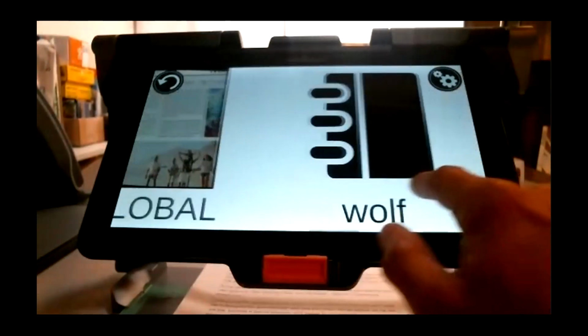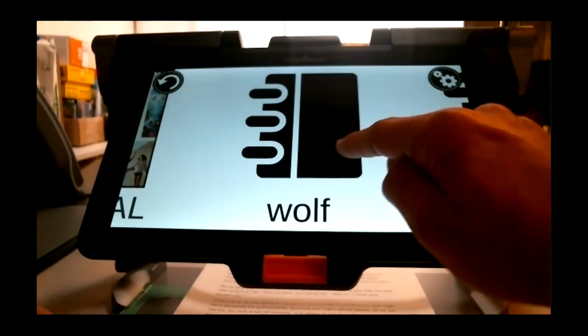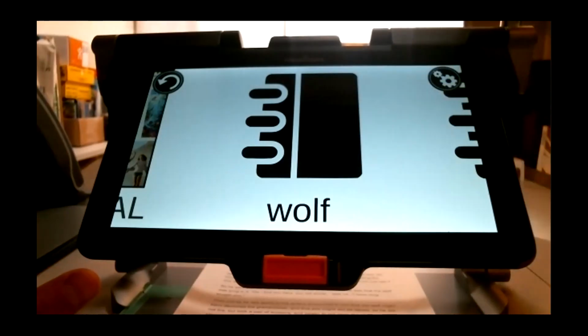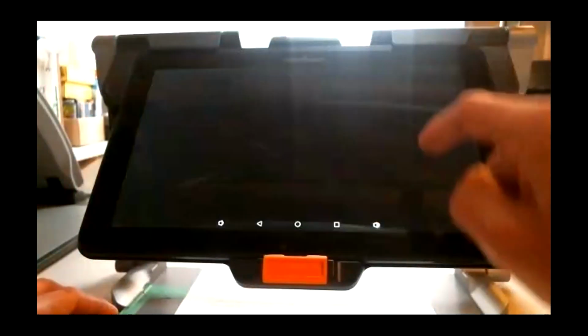Now, maybe the reason why I'm getting this is that I've installed a build which the programmers are still developing, just to give you that scoop. I wanted to show you that toggle between the different applications in Android. So that's maybe why I'm getting a "Prodigy has stopped." It's not a stable build.